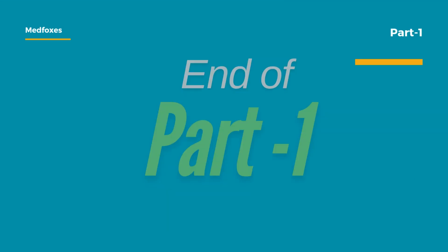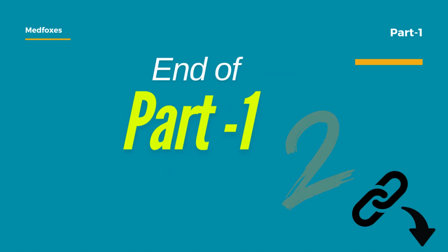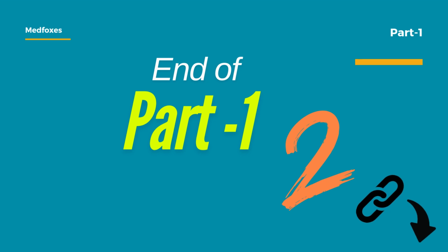This brings us to the end of part 1, where we introduced the basics of the cardiac axis and how to interpret it using lead 1 and aVF. In part 2, we will continue from where we left off and dive deeper into practical techniques, including the Quadrant Method with clear ECG examples to help you master cardiac axis interpretation.